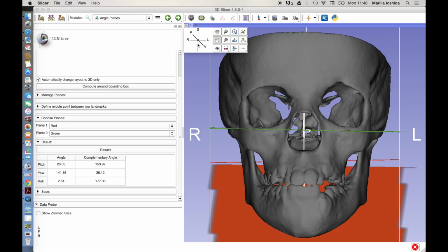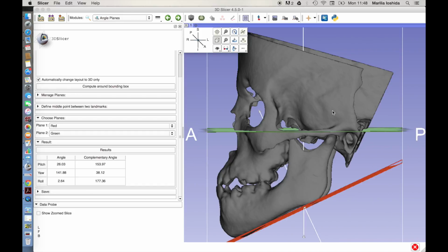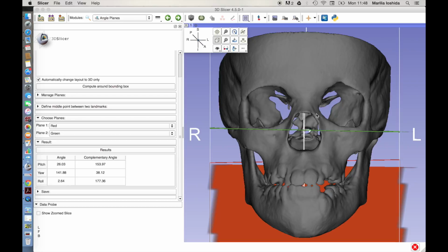Whenever we have an asymmetry and you have 4 points, you can choose 2 points to be your base points, as we do with Porion, then choose an average point for your other points.